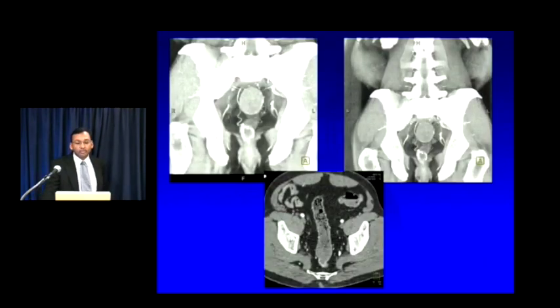As I mentioned earlier, most of the AVMs that I've seen in my practice have been in the rectum. Here's an example where there's an early draining vein, a tangle of vessels within the wall of the rectum, and this large hypertrophied feeding artery. Notice that it's much easier to make this diagnosis on these MIP reconstructions, or these 3D reconstructions with VR, but it's actually relatively subtle when you just look at the source axial images.